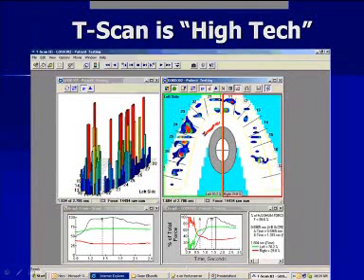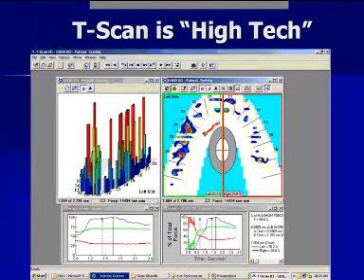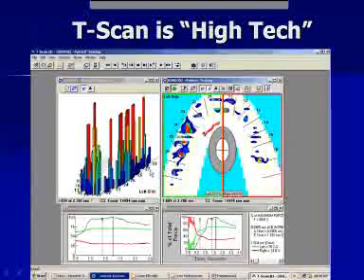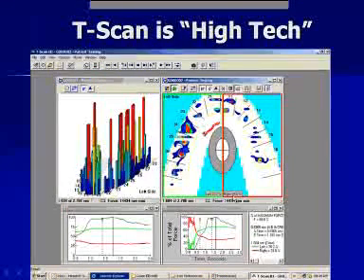70% of the forces is on the patient's left, 29% on the patient's right. The new software, which many of you have, will allow us, with the click of a button, to actually break down how much percent is per tooth. But for patients, it's good to just show them right and left. You could break it down, and I bet you there would be an awful lot of percentages here in this area of the upper first and second molars region. So parents see this.